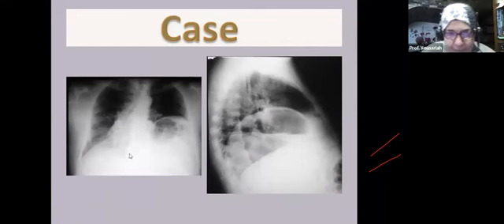Now, elevated cupula. Here we have an elevated left cupula. Why is this an elevated left cupula? Why is this not, for example, an abscess? Okay. Why do we consider this a cupula and this a subphrenic, not a supra or a lesion above the diaphragm? Now let us see. We have this here, above the lucency on the left side, a whiteness or an arch extending from most medial to most lateral. Okay, and in the lateral study, it extends from most anterior to most posterior. This is the anatomy of the diaphragm.